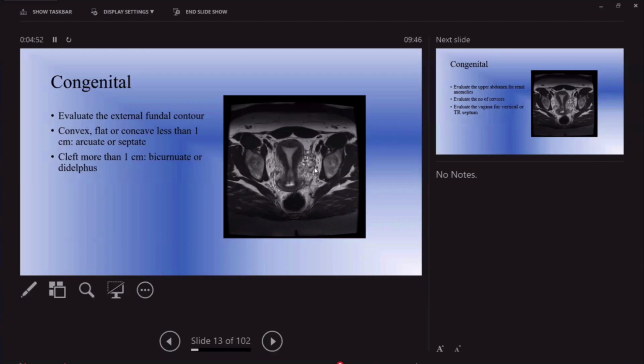So the first thing that I always say is that your protocoling of the MRI is crucial, and it has to be good. There should be minimal artifact. You always have to have what we call a long axis sequence of the uterus. So when we do a sagittal image, I will try to ask the technician to take a long sequence along the long axis of the uterus.